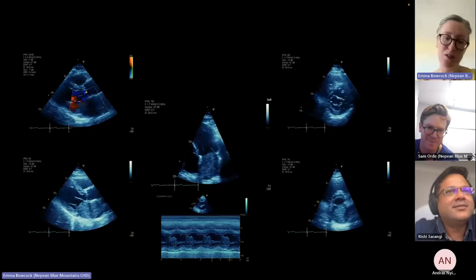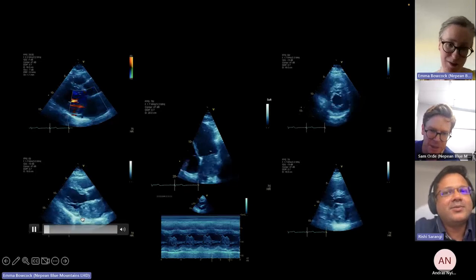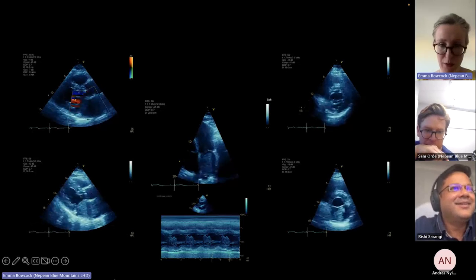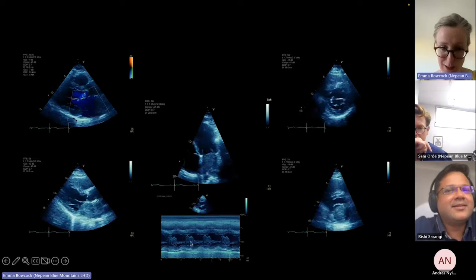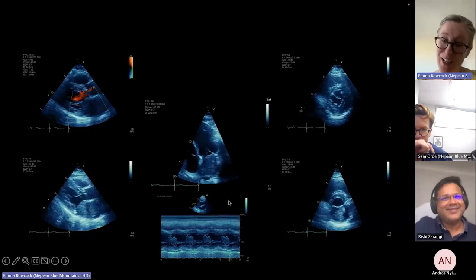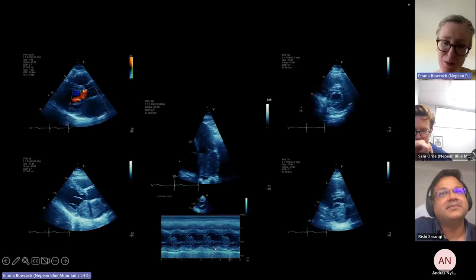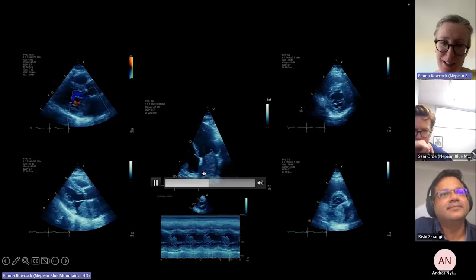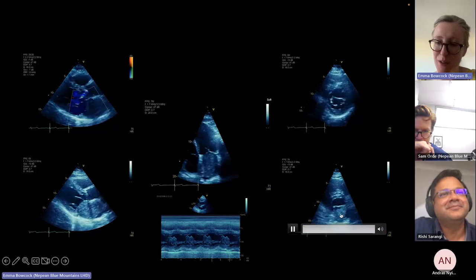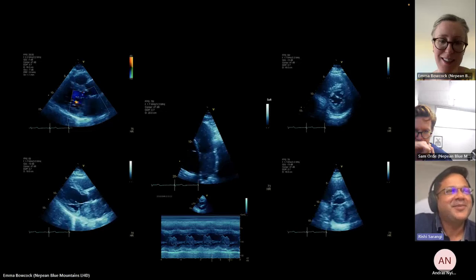Yeah, so this huge heterogeneous mass in the left atrium, taking up most of the left atrium, and protruding through into the LV. You can see it beautifully on M mode, just filling that whole mitral inflow. But they like to show things like this as well. Again, that snapshot, and say what could this be in the ASA exam. It's obviously connected to the interatrial septum, as they often are, and you can see it just coming through the mitral inflow there on the short axis. Almost like contrast filling the left atrium up there.